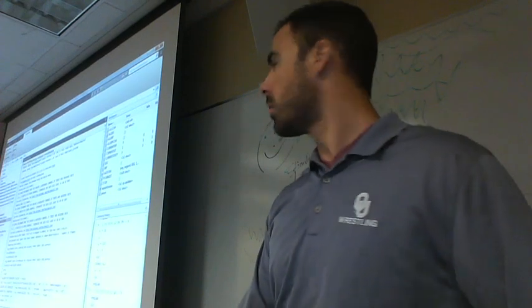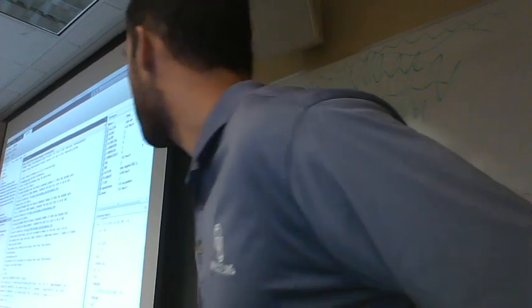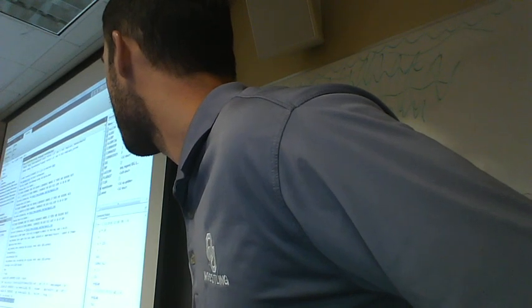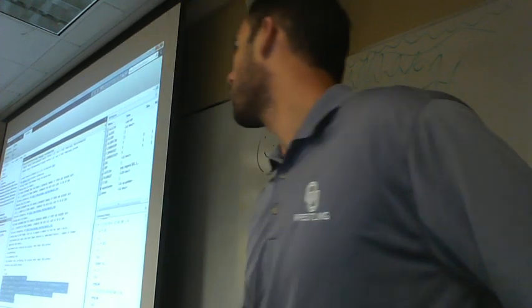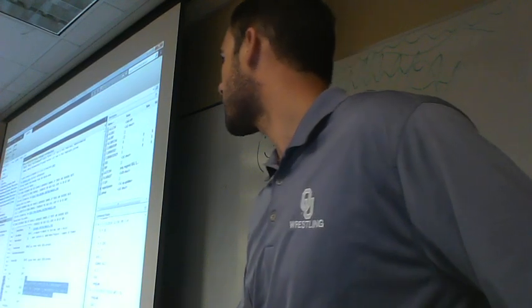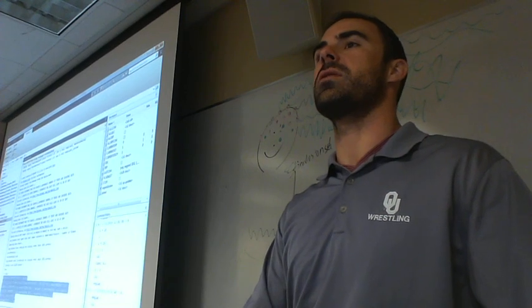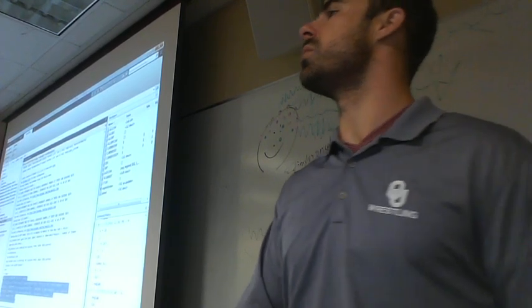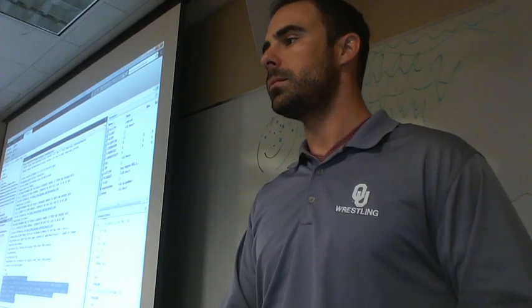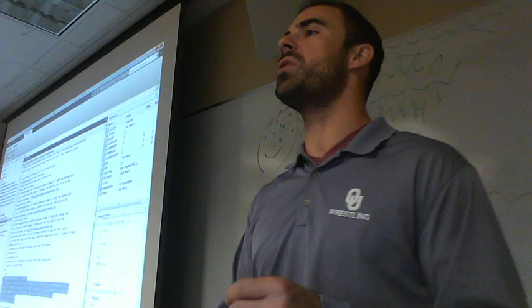Okay, you guys see what came out here? So eegh. One thing we can do is right-click this and copy it. What eegh does, the h stands for history. So you're asking the computer to give us the history of what we wrote in EEGLAB, or what we did with our computer.